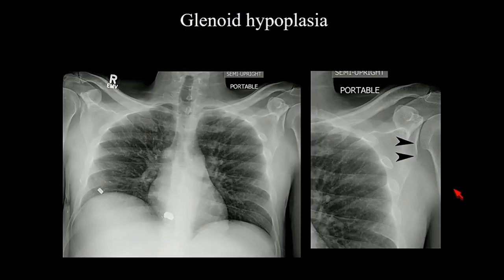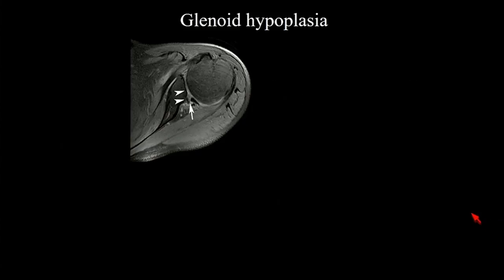Okay, so we're going to go through this. On a chest x-ray, this is shot straight anterior to posterior. If you think about the lie of the glenohumeral joints, they're angled. Think about any chest x-ray or chest CT you're reading. There's an angulation to the glenohumeral joints. They're not straight in face with the x-ray beam. So if you happen to see the glenohumeral joint in profile, you know there's something deficient about the angulation.